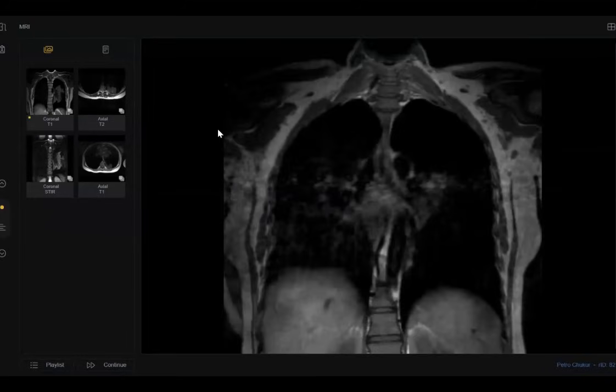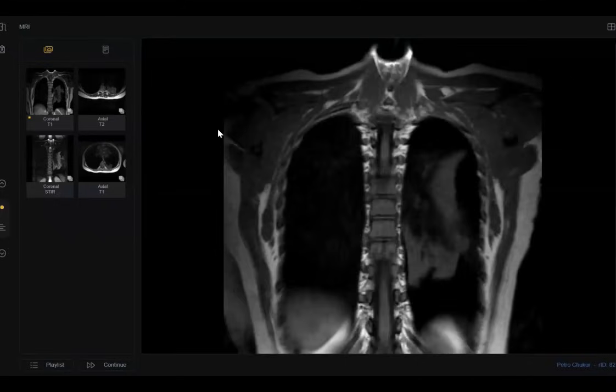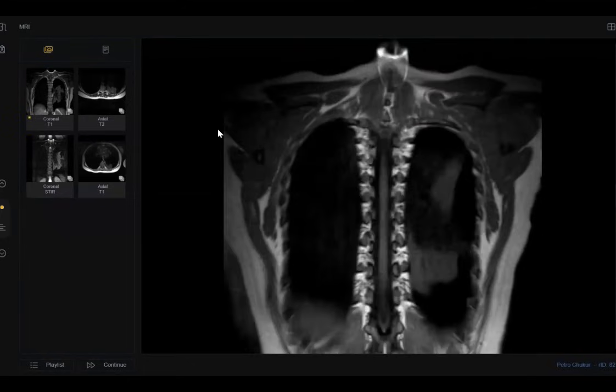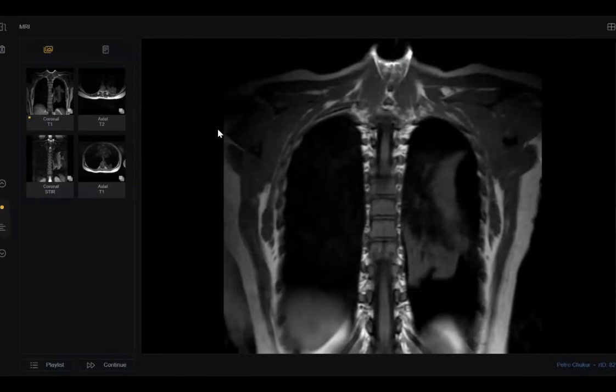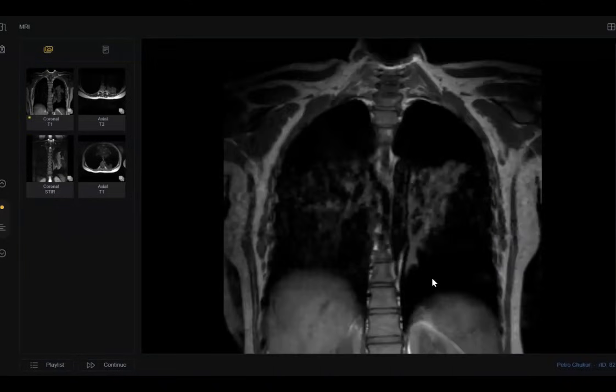What do you think? What's your differential? My differential diagnosis would include the superior segment lesion of the left lower lobe, as well as the possibility of a posterior mediastinal lesion. Okay. Do you think if all of this is tumor, it will be polite and will not infiltrate anything? Look here, no any infiltration. Think in another pathway, please. In another possibility.